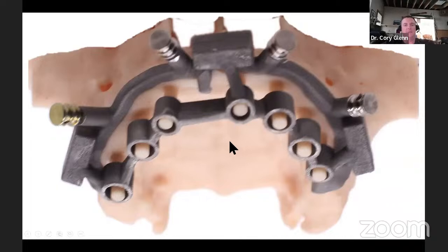So going back to the person who asked about exporting various surfaces, the way this model is generated is I just exported my reduced maxilla and my custom abutments, which were like 3 millimeters in diameter. When I exported those together, now they're one STL file, I can print those. And that gives me a model that I can try all this stuff on. My temporary, my drill guide, all of that.